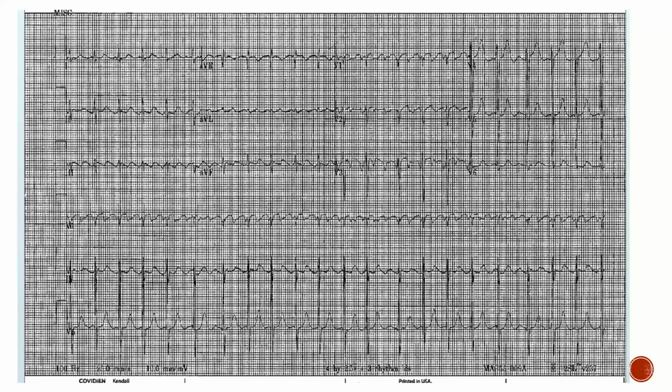And this is the ECG that he had during the emergency visit. As you can appreciate, the sawtooth appearance in leads II, III and aVF, with inverted flutter waves, suggests atrial flutter with an atrial rate around 300 and a ventricular rate of almost 120.